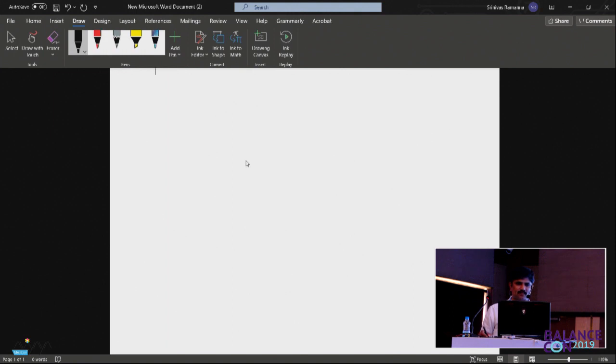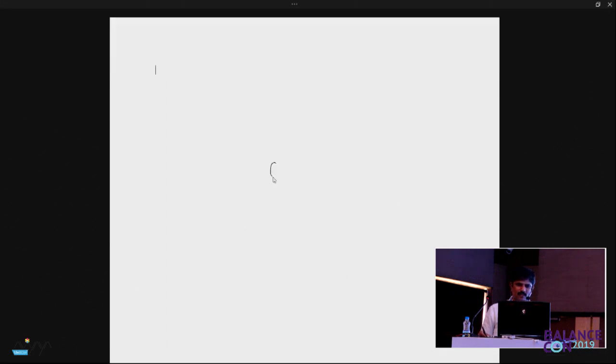Now, please open the first page here in the BalanceCon 2019 Mysuru. Hypometria. Okay? Now let us give the eye a task. Let us give one particular dot here. The eye has to look at this dot. Then the eye has to look at another dot to the right side. Fine? The instruction to the eye is to move between these two dots.